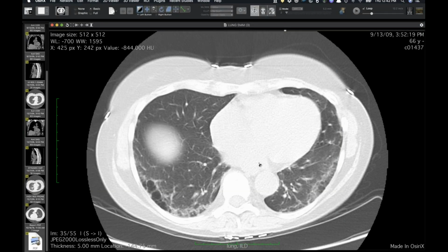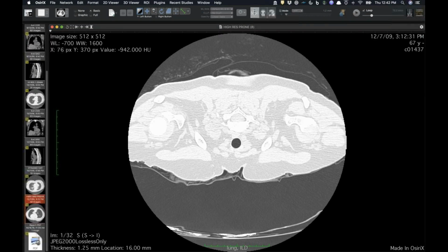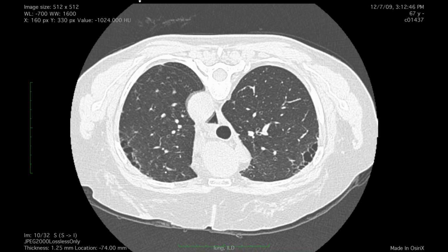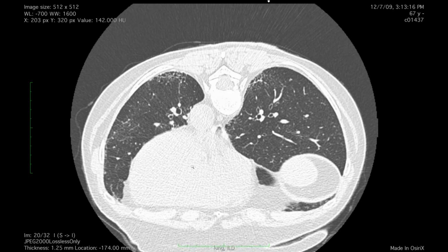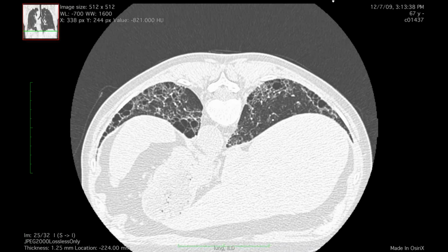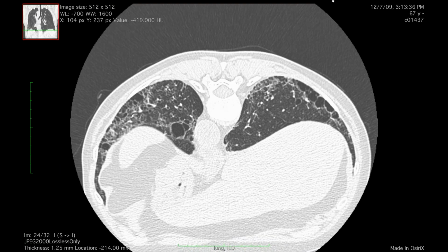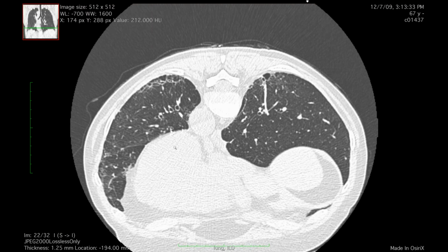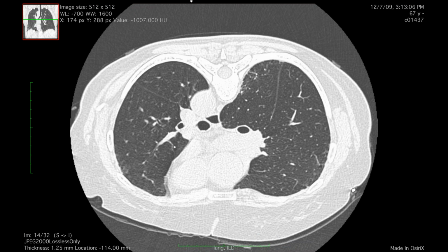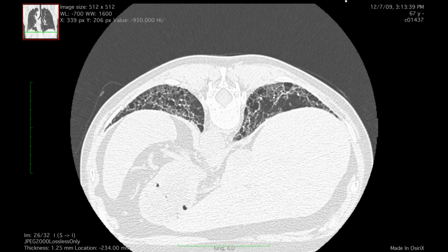No, I mean, it's good to get path on it. It's good to see path on this case. We see this a lot, and we don't know what to call it, and our clinicians are like, "You're telling me that's not honeycombing," and you have to say, "No, it's not," and they look at you aghast, because these are just bigger irregular spaces. And the airways, there's no bronchiectasis associated with it. Right. That's the other thing too, and maybe minimal.